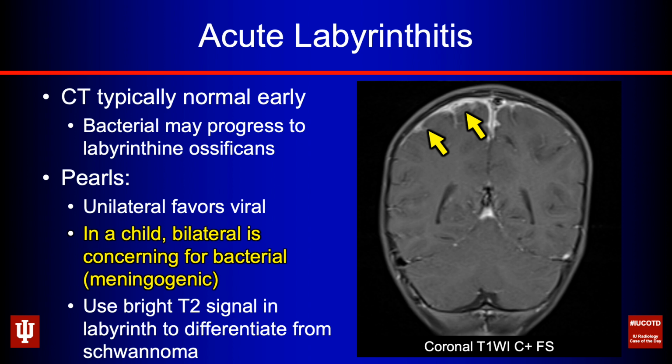Look at your T2 weighted imaging, your high-res, your T2 SPACE, your CISS, your FIESTA, whatever you're using, and if there's a segmental filling defect there, be thinking about an intralabyrinthine schwannoma, because the infectious stuff tends not to have such a defined, quote-unquote, filling defect on the T2 weighted imaging.